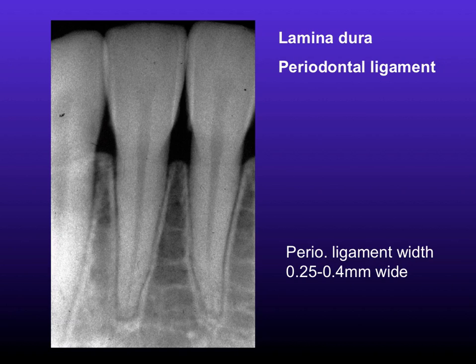But we do look at the relative width of the periodontal ligament in different parts of the tooth attachment, as this may indicate local disease, the most obvious example being periapical inflammation, where the ligament space may be wider around the end of the root of the tooth. Trabecular bone is what we see in between, around here and going up here, which typically has a very lacy structure.